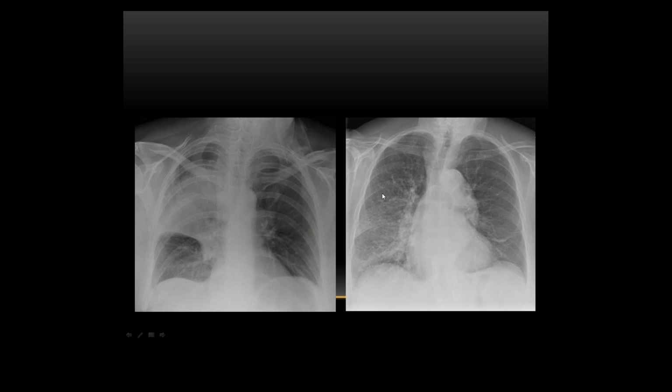Looking at your right-hand image, there's a ground glass sort of appearance, consolidation in the right lower zone. Are they both pneumonia? Is this just a more advanced case? No. This is consolidation. This is cancer. As I was saying earlier on, one of the things that you can get accumulated in your alveoli is cancer cells. So bronchoalveolar cell carcinoma in situ. That's exactly what that is there.